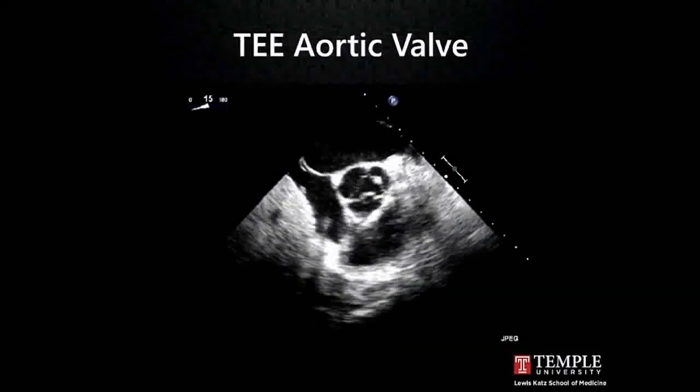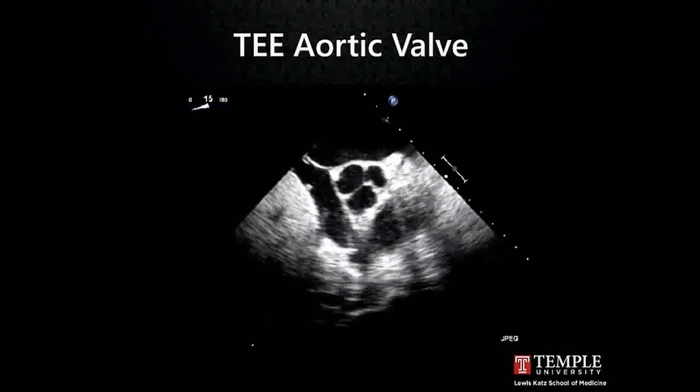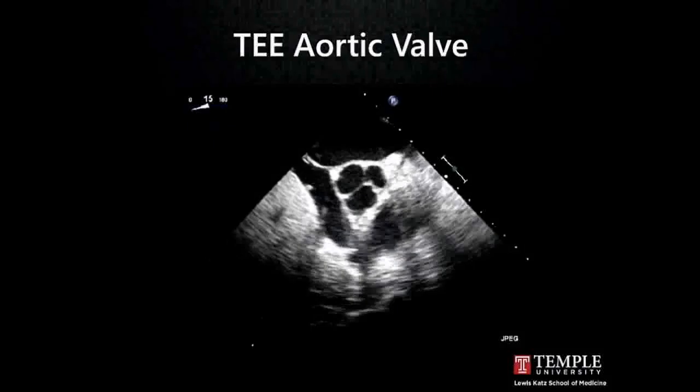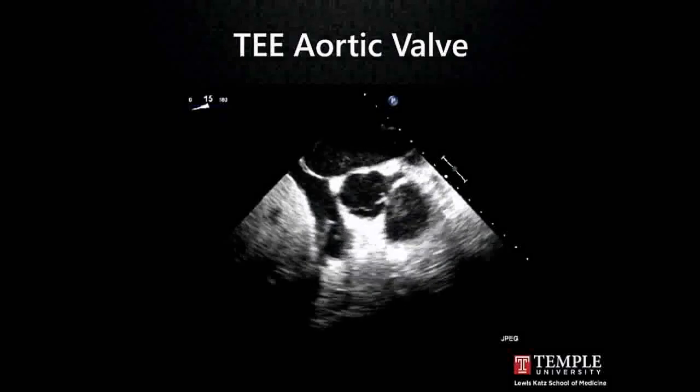They like the idea of correlative imaging between our modalities. So keep an eye out for studies where you can identify coronary arteries on TEE as well. In this case, you can see the left main originating from the left coronary sinus, and you can see it bifurcating into likely a circumflex and a LAD vessel.